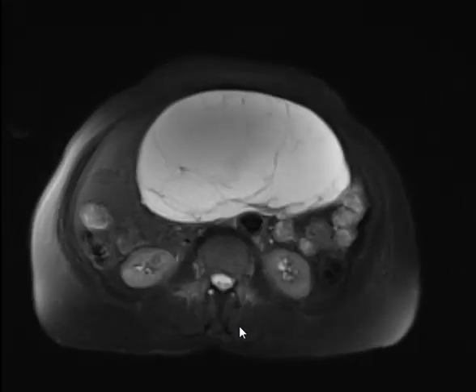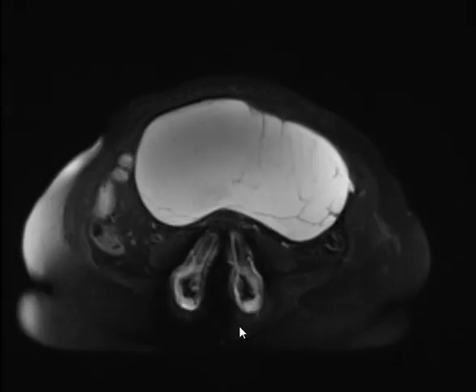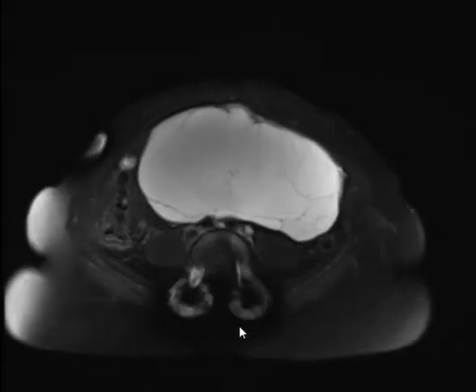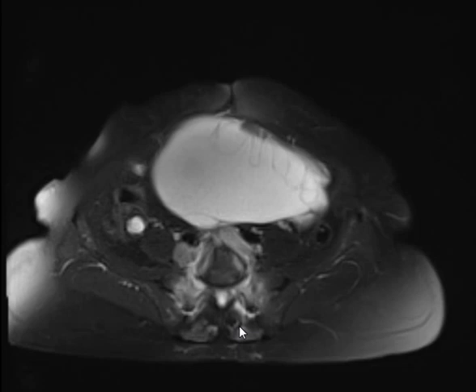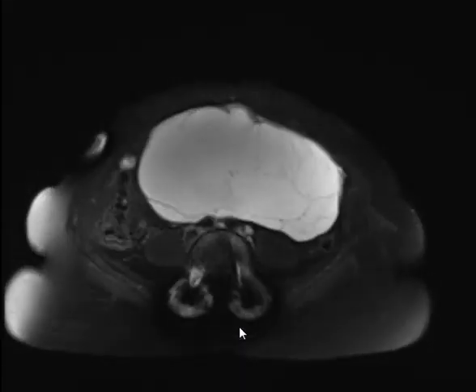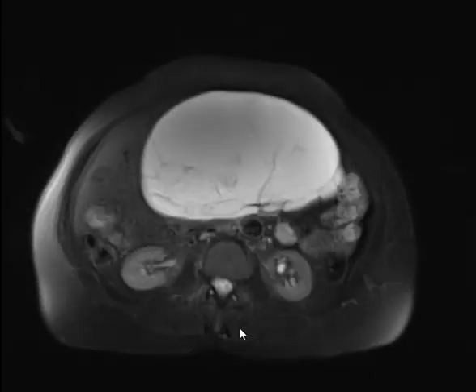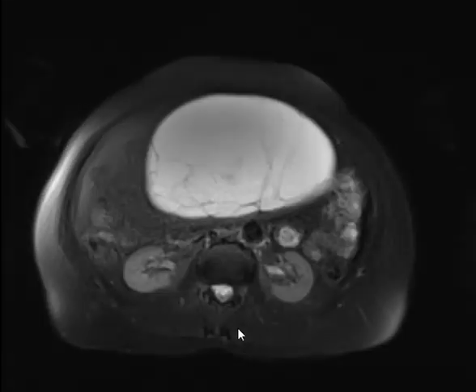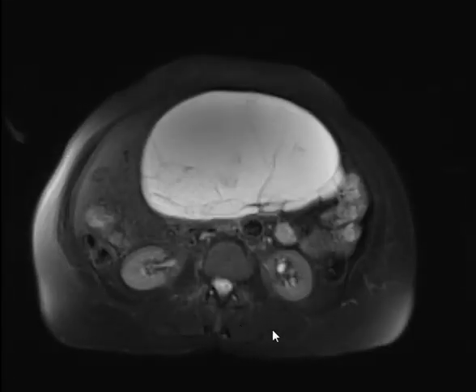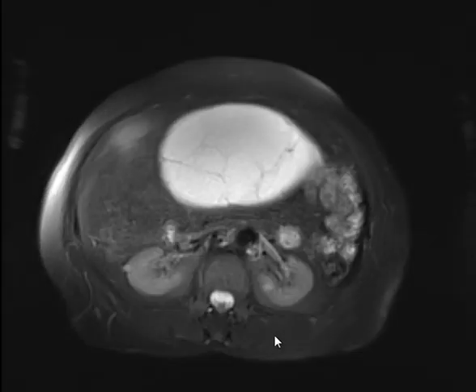It's a very easy case, up to your level, let's say. Nothing, straightforward, no weird syndrome. What do you see? Tell me. They are helping me. I know they are helping you, but you don't need their help.